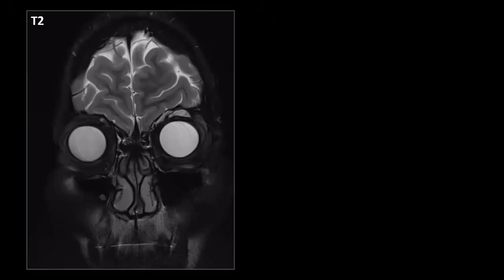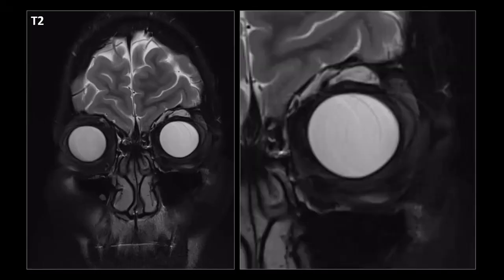They do not only occur in the conal compartments, but can basically occur in all compartments. And this is a final vascular abnormality. If you look at this image, this was a patient who presented because of proptosis when bending over. This is very peculiar, but also very typical for one specific kind of vascular abnormality of the eye. What do we see?